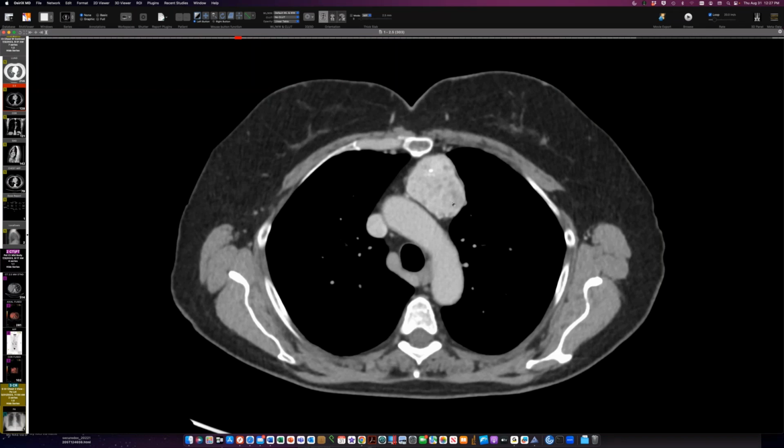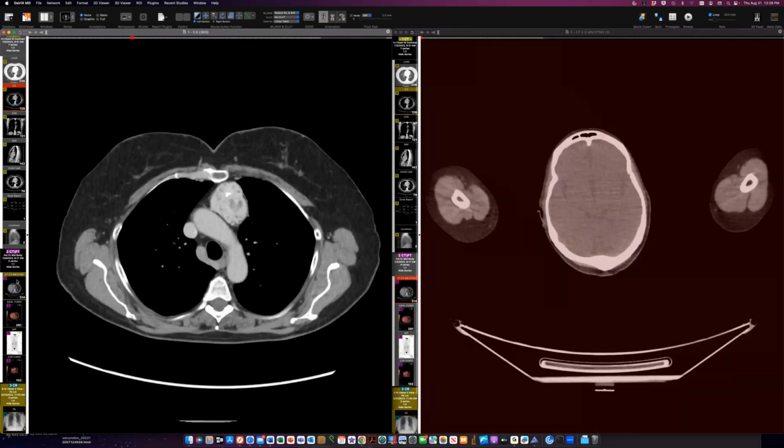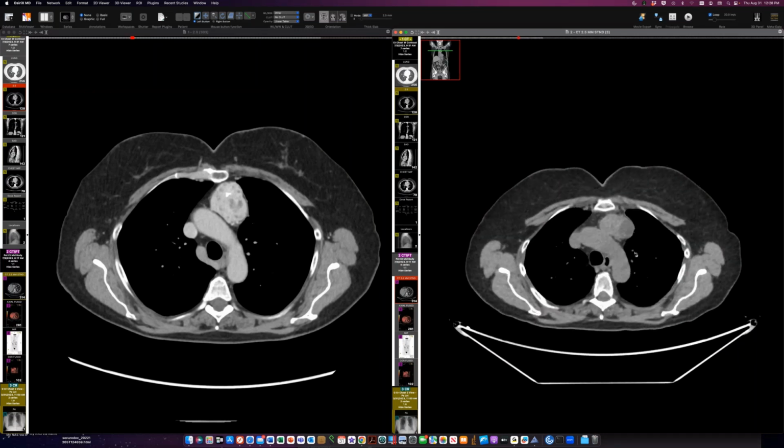So Dave, can you put the non-contrast alongside that? Because initially I wasn't personally impressed by the attenuation of it on the non-contrast. You can see on my display it's lowish, but it's not fat, and it doesn't look like degraded hair, collagen from hair forming in a germ cell tumor.